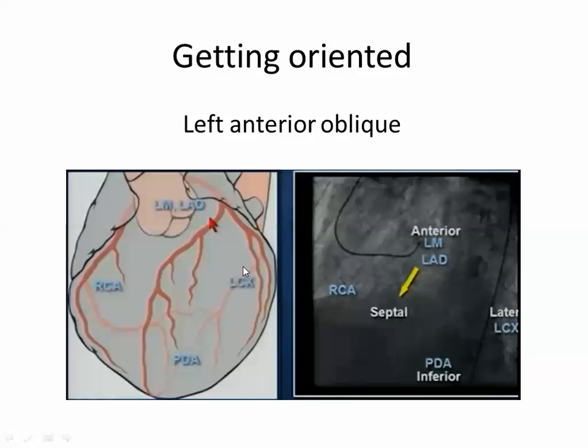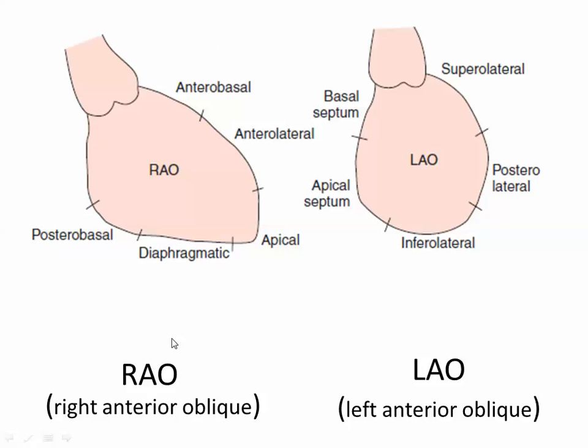So this is the short axis of the heart. This is the LV. This is the RV, as a crescent on the LV. And this is SALI, septum anterior lateral inferior. Septum supplied by the LAD, lateral by the LCX, and this is by the PDA. Again and again.